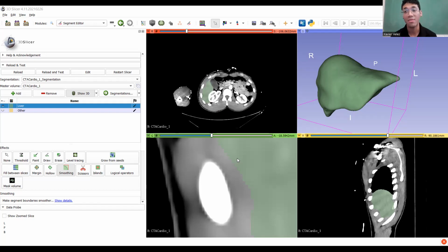Okay, so from here, now we're going to go into how to get this ready for 3D printing. This won't be a comprehensive guide, but just in terms of using our 3D printer, what you'd need to actually load into the 3D printer. Unfortunately, 3D printers don't really know what to do with just an STL, an object file. They don't really know how to read that, at least not the ones that I've worked with. So we're going to want to convert.